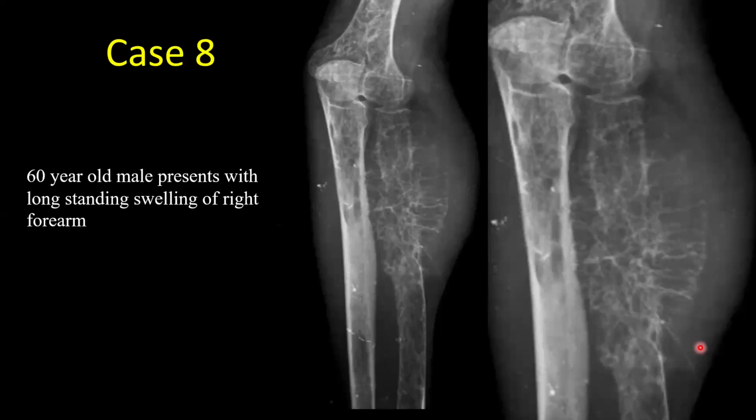Can any resident diagnose this case? Spotter. I will put it in the spotter in the quiz.